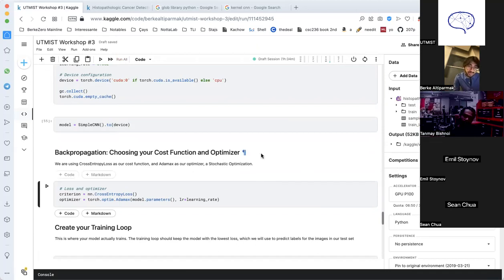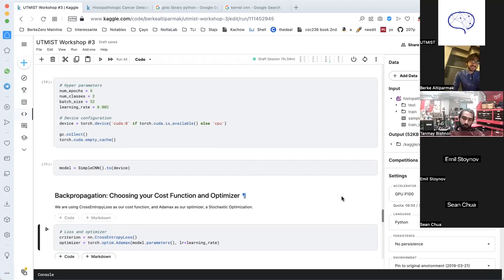But did you change kernel size? Kernel size doesn't change. In_channel becomes in_channels. Out_channel becomes out_channels. Don't change anything else. So this was a mistake I made. We fixed it fairly quickly.